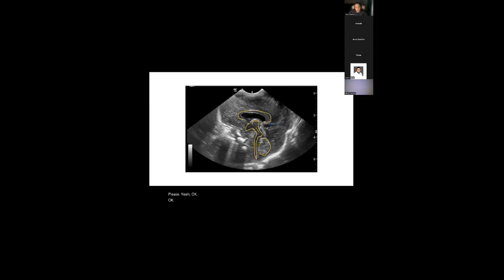It's a very immature baby. What you've really got here is you're demonstrating the parieto-occipital fissure, which is commonly seen when the baby is quite immature. As the brain enlarges and becomes more mature, this becomes less prominent, and then finally you see an overlap.